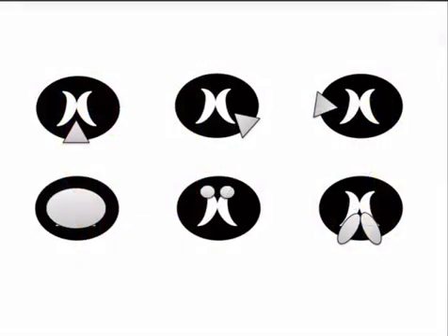All right, so this is a picture from one of my books, and these are cuts through the spine. This is showing you different areas that would be T2 hyperintense, the areas of demyelination. So these are all the different patterns of demyelination, and you'll see that they overlap, but I want to point out the classic looks.